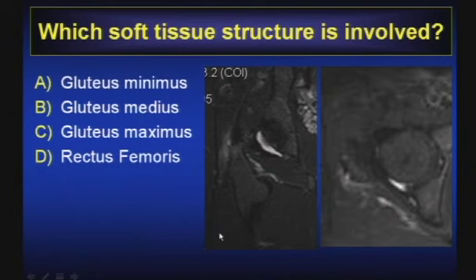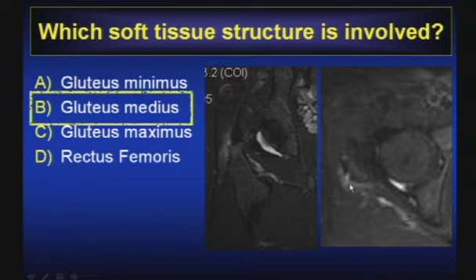Okay, one more quiz question here. Coronal image. Now you have to kind of know where you are anterior to posterior, don't you? So you're starting to see that excrescence of the greater trochanter pop up. Look what's coming down here. That's the gluteus medius tendon, right? Main tendon. So if we come down, we're seeing, again, high signal intensity at the lateral facet. So this is going to be a muscular attachment gluteus medius abnormality.